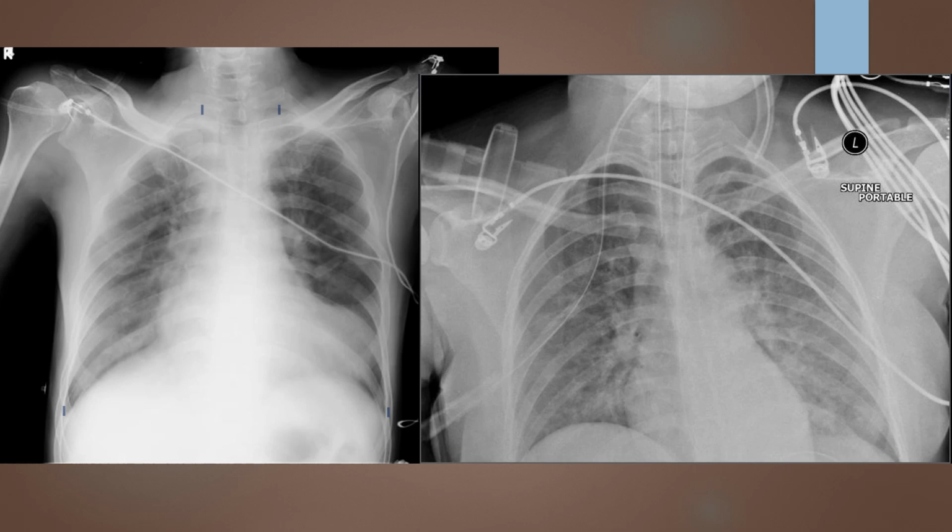So I'm going to go through the rest of my evaluation criteria. The first thing I'm going to look at is, is my patient's mid-coronal plane parallel to the image receptor? When I look at this particular image, here is an SC joint, here is an SC joint. So this patient is rotated, with the gap between their right SC joint and the vertebra. This would indicate that they are rotated into an RPO, moving that SC joint away from the vertebra.